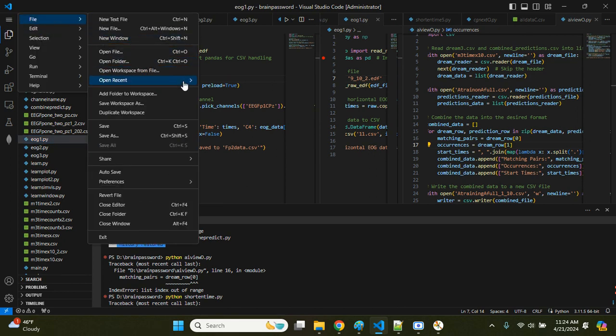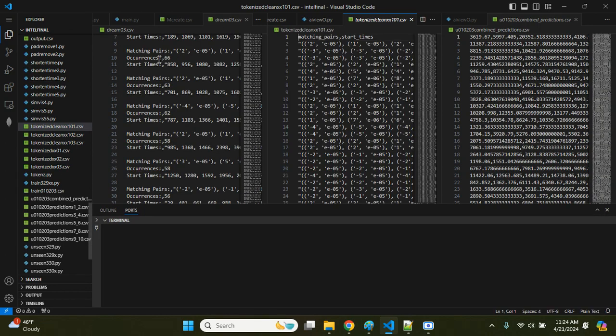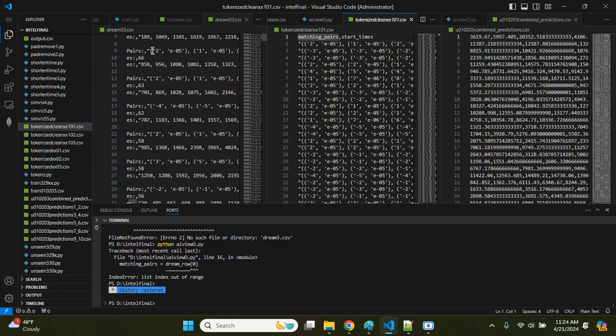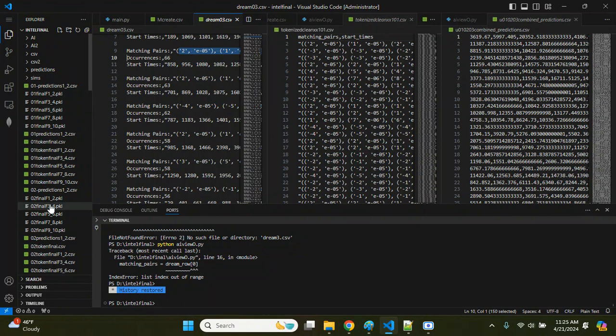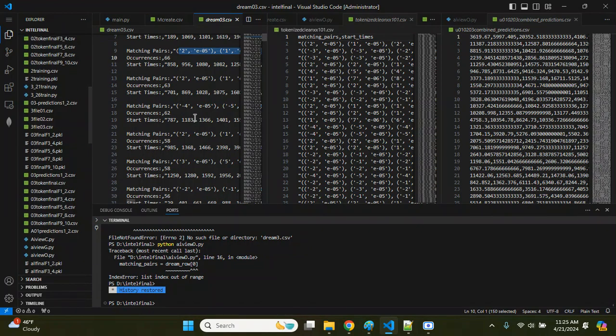If I go to another one, you'll see that the data was at, what, point zero something, and you would have seen three of them and a minus sign. But now this data is different. This is sleep data instead of being awake and thinking and doing something.